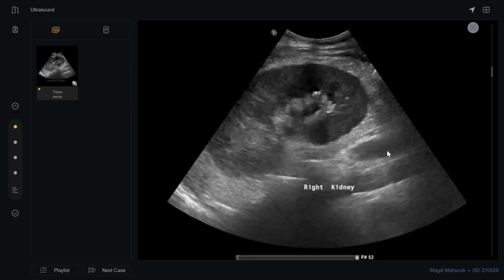There is an echogenic focus in the kidney that can be a calculus, but it is not showing any distal acoustic shadow. And mild hydronephrosis is also present in the right kidney. So, putting it all together, the patient presented with pain and oliguria, with perinephric fat stranding and large kidneys, and a heterogeneous echogenicity area in the right kidney.